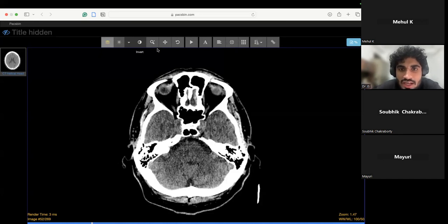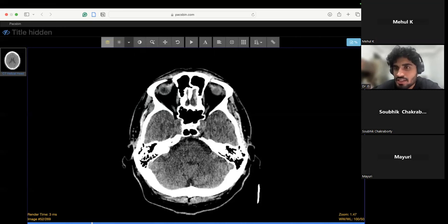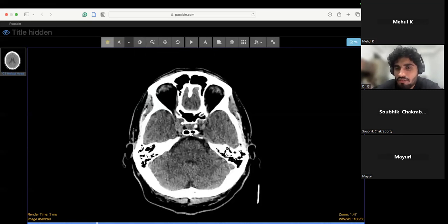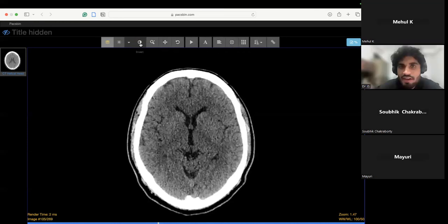How to describe the area of blood, as in frontal and temporal? Same. Area of bleed means again we go ahead with this formula only, ABC by 2. We'll just calculate it. Usually in this PACS, you don't have calipers.